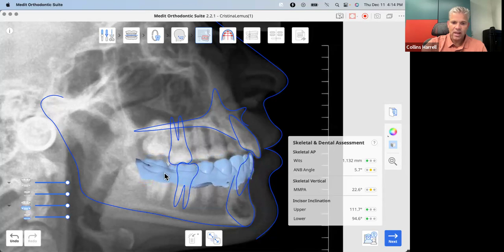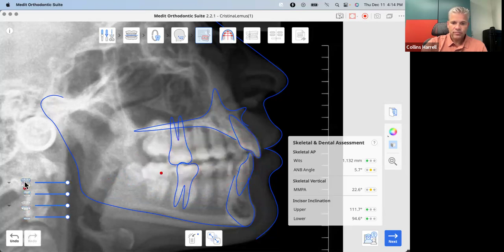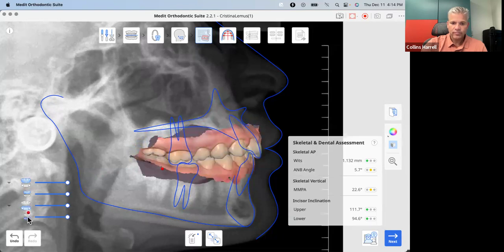I think it's sized correctly, but I got it positioned too high based on that X-ray. So if I just come back here, same size, but I'm just going to reposition them. That looks better. But interesting, see now that upper incisor doesn't seem to match quite as much. So if I try to match the upper incisor, it would look something like that. And then the lower's off. So again, sometimes it's hard to trace and know which one we are tracing here.